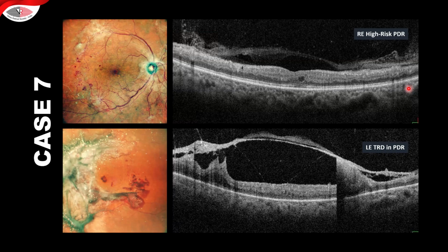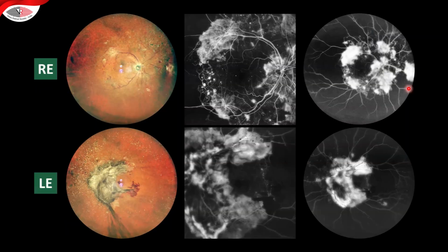There, you need to do surgery to make a difference to these eyes. You also need anti-VEGFs as preparation because they may bleed a lot. So you need adjuncts of that. But when you do an angiogram in this case, you can see the full extent of the damage. Of course, the right eye needs a lot of laser and regression so that you can save what is there, or save some of these eyes from neovascular glaucomas. Even if they have potentially very low vision, they go into neovascular glaucomas, which create a lot of damage in the long run.